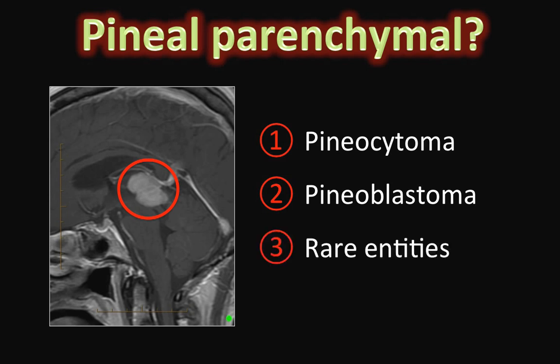You might come across a few rare entities when reading about this topic. However, these entities, as we just mentioned, are very rare and very difficult to differentiate from the more common pineocytoma or less common pineoblastoma.